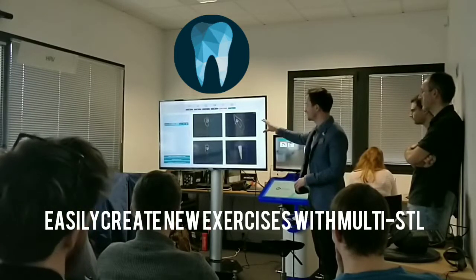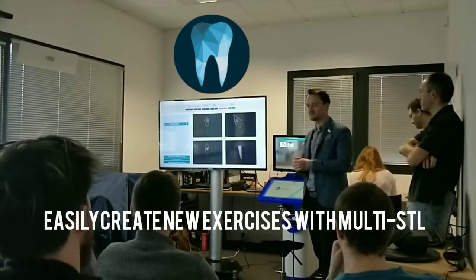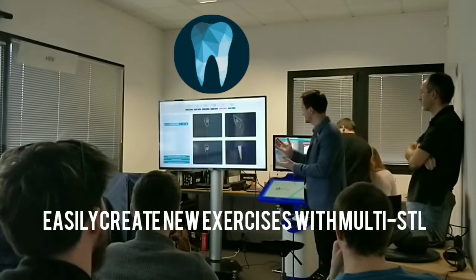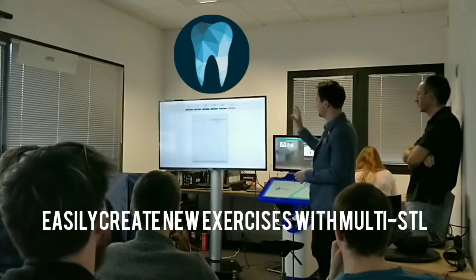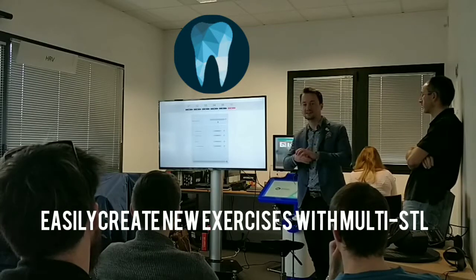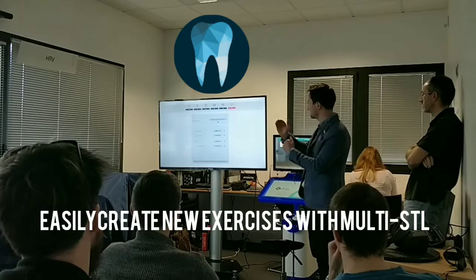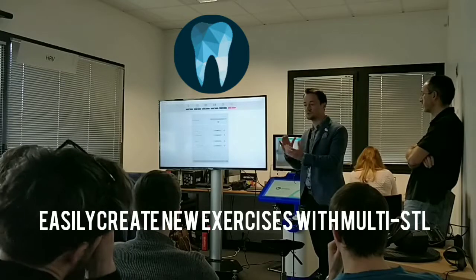There we go. So the target is what we're actually aiming for when we do the exercise. So for prosthodontics, we could put this around the whole tooth, and in this case we can copy it from the caries. And finally, the evaluation. So here is where we set the parameters that the simulator is going to automatically score the students on. We set the threshold for what's acceptable and what's not, and we can select as many or as little criteria as we want.